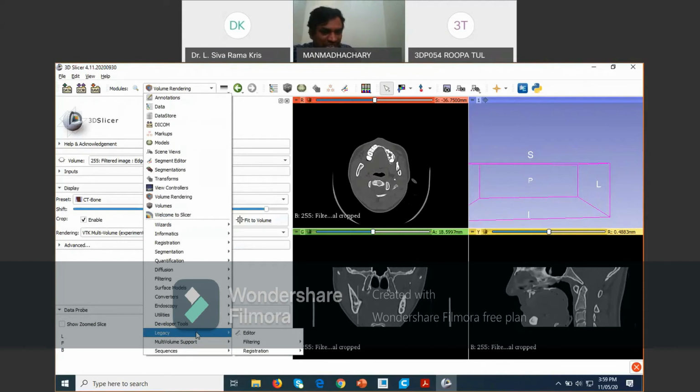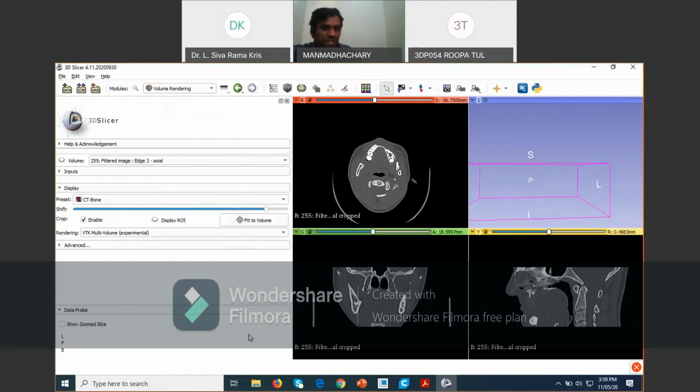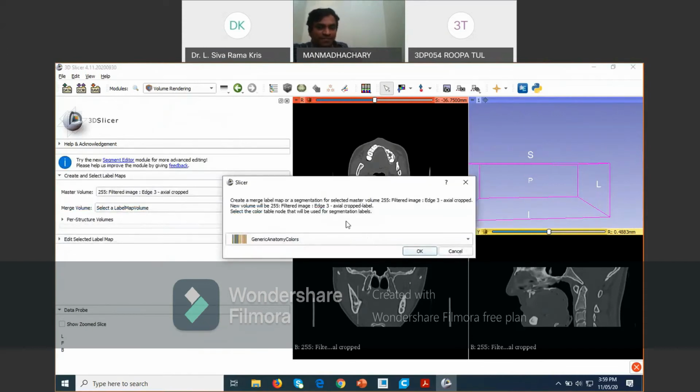Yes, sir. I have done this one, editor. Okay, now come here, generic anatomy color. Here it is automatically choosing the anatomy, which anatomy is required. Then click okay here.